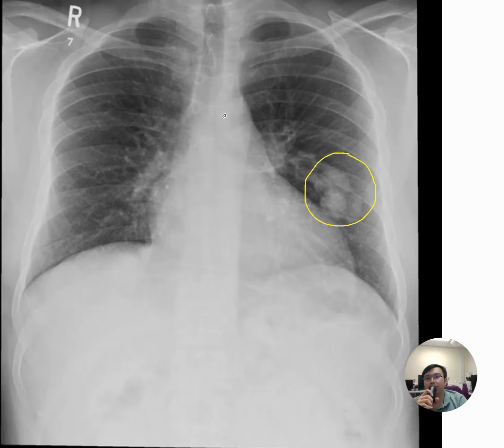So you do not need to be very confused about whether they are just coincidentally some lung markings projected over the lesion or whether they are genuinely communicating. There must be some abnormal appearance of those communicating pulmonary vessels.